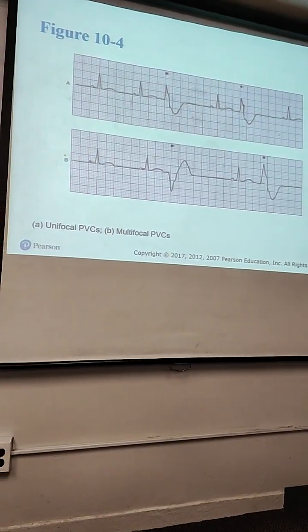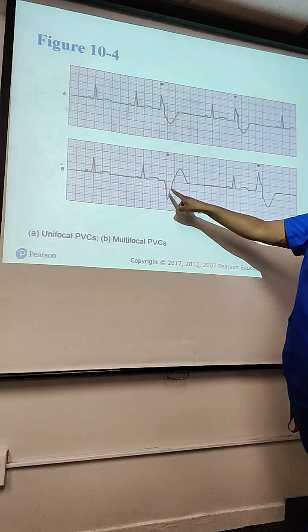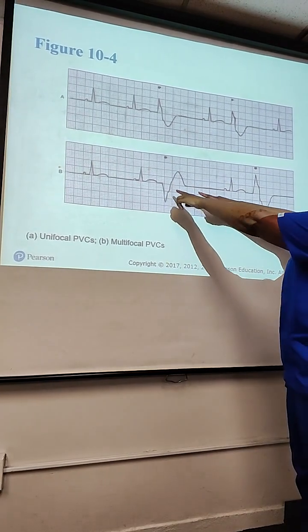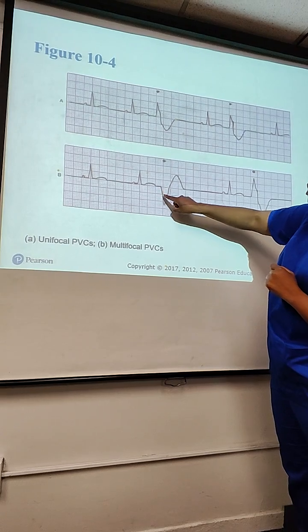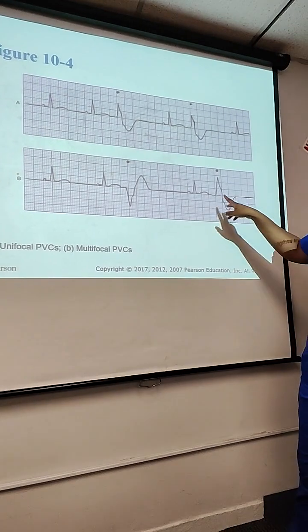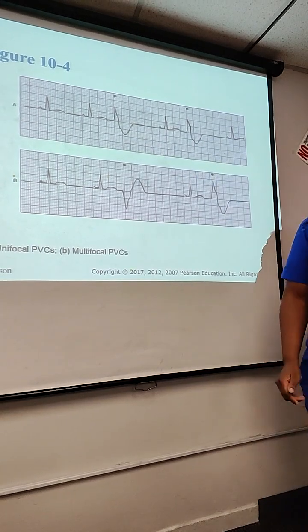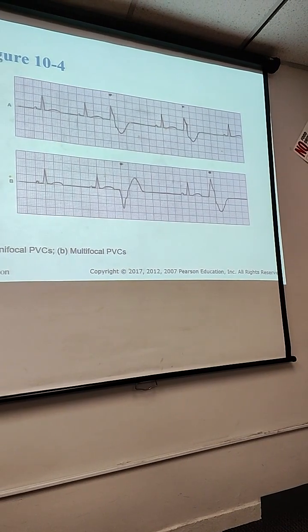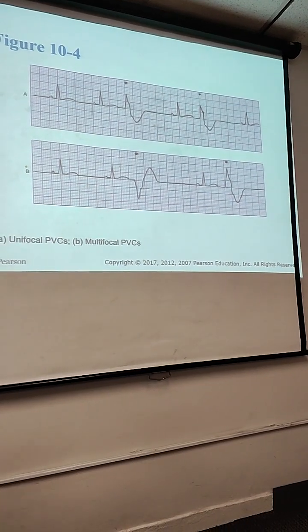On this one, both of them, the ST are both negative, but here it's not the ST. Here it's the, what would that be? The QR. And then it changes here, so it's two different ones here and only one there, but I don't know the name. That is correct. Remember, pay attention to this picture.